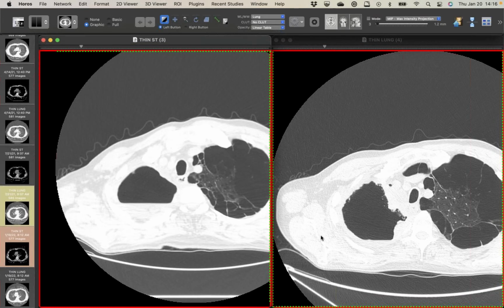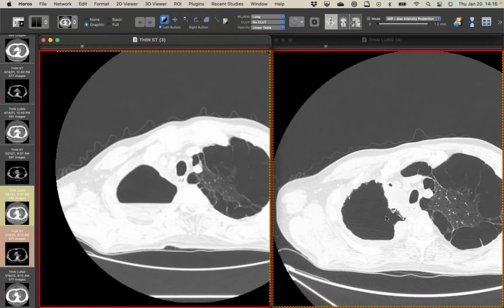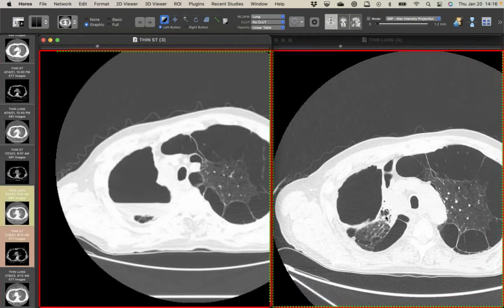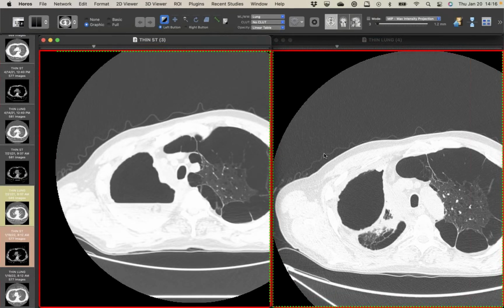I don't know if it's called a sequestrum or not, and probably due to a combination of just devitalized tissue complicated by that definitive radiation treatment that covered the cancer field, but also the hilum. So it wasn't your typical SBRT pattern. I don't have the treatment plan, but it wasn't your typical target, the nodule. I guess the alternative is this is a low-grade chronic infection that has also led to sloughing, but I would have expected the patient to be sicker, have more symptoms related to that. So it may be chronically low-grade infection, but I don't think I've ever seen sort of sloughing like this from anything. Wow. So that's fascinating.